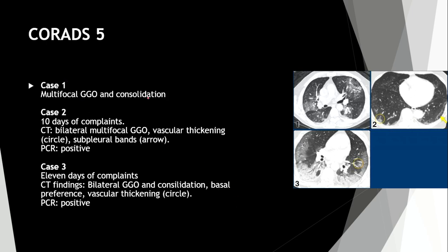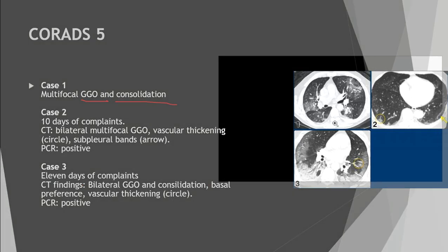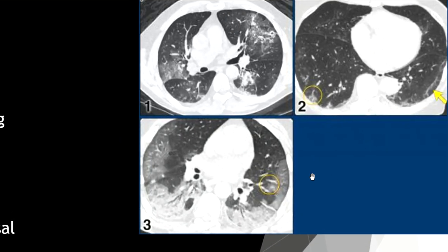Alexander Prokoptsov asked what the difference is between ground glass opacity and consolidation. It's not very high resolution, but I'll try to explain.